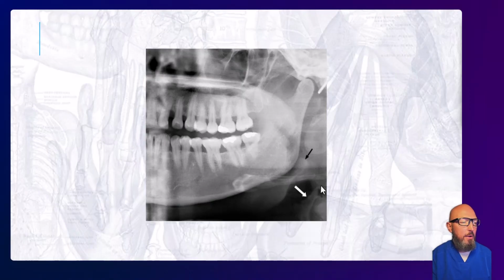Then do you see the hyoid bone? It's horseshoe in shape, and in a panoramic image, you're seeing it from the side. So you see the hyoid body. A lot of times it projects over the mandibular body like this. And then the greater cornu of the hyoid bone projects posteriorly. And the ghost image of the other side kind of stretches across it like that, going off the lateral portion of the image. So don't call this the clavicle.